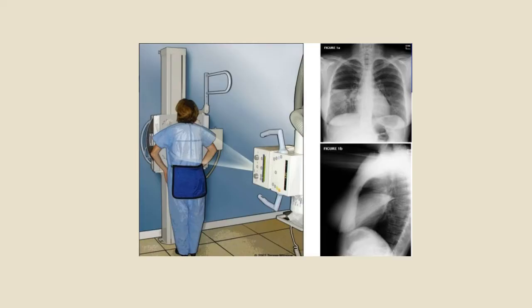In today's video, we will be discussing the chest film. Let's start with the absolute basics. A radiograph, colloquially referred to as an X-ray, is the image that is produced when radiation passes through an object and onto a film or light-sensitive surface.